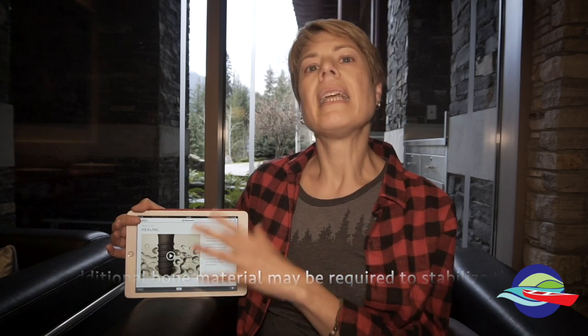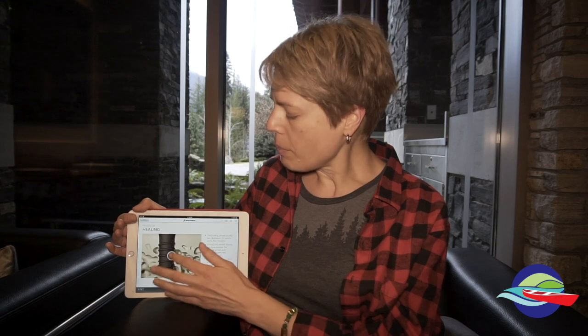And I let them know that either type of bone has no living cells in it. There's no blood product. There's nothing to match. It's basically the mineral source of the bone, the calcium and phosphate, and it looks like table sugar. And what we do is we pack that around that area, and then we tuck it all underneath the gum. And as their implant matures, so as the bone becomes attracted to that titanium root, then those cells will also take over the cadaver bone or the bovine bone, and eventually it will no longer be donated bone, but it'll actually be their own bone, reinforcing that area, extending the life of that implant, which is really important.